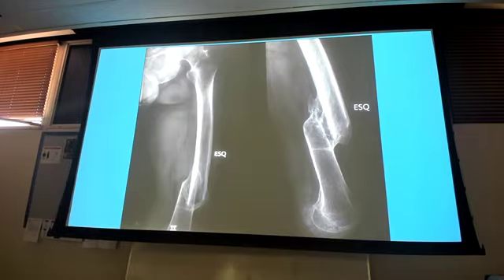We just covered all of those. So which one would this be? Malunion. It's all one bone. They may be in two different areas, but look, I've got cortex connecting these two and bone connecting these two up here. These are all connected. This is all one bone. This is a malunion. This one is likely getting rebroken and surgerized to fix, because one leg's going to be a lot shorter than the other. Telling the truth.